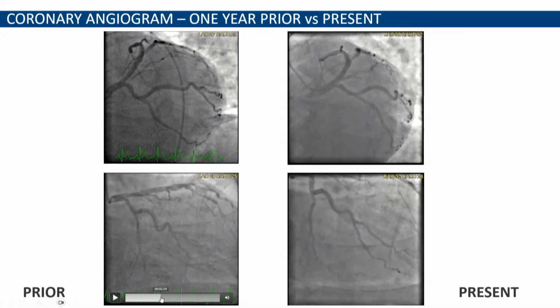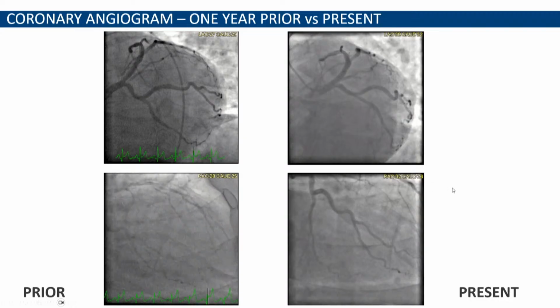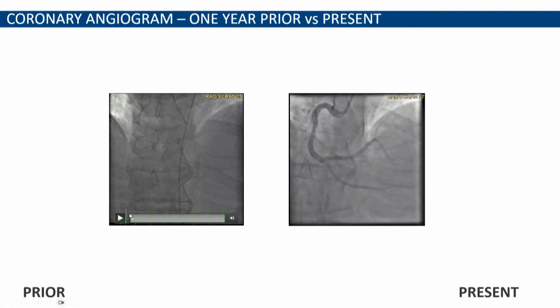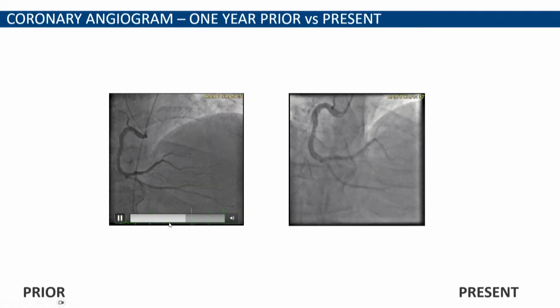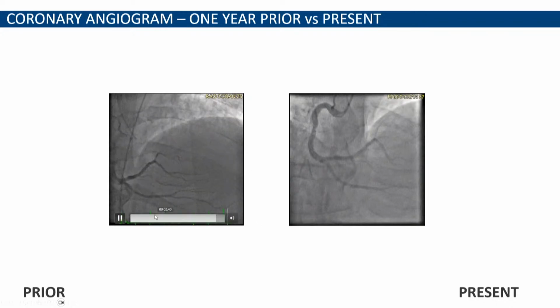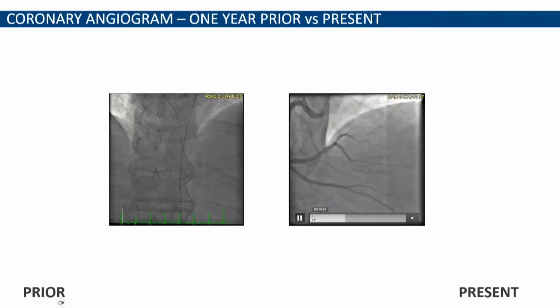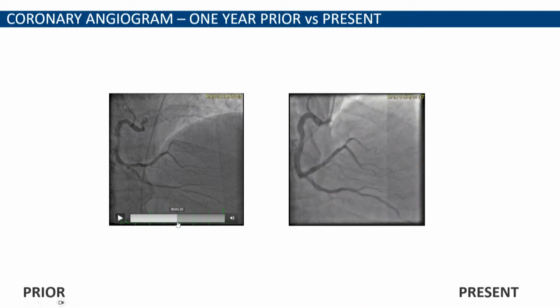Nothing. Nothing. And then we go back and we see now the RCA. Looks clean. And no significant disease.